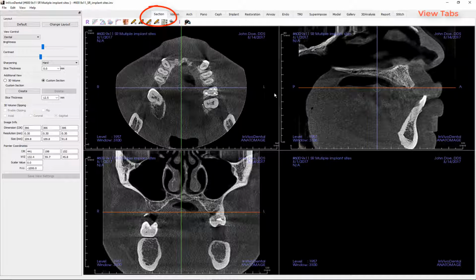These reconstructed volumetric data sets of the patient scan are displayed in three viewing windows, the axial, coronal, and sagittal, as multiplanar reconstructions of the image structures. The top left viewing window is looking up from the bottom of the patient's head at a specified thin slice of the anatomy. The orientation of the patient is shown on the screen with the patient's right side on the left-hand side of the viewing window and the patient's left side on the right side of the window.